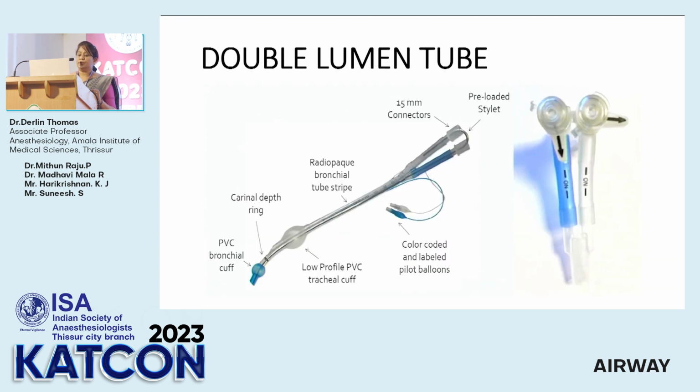So this is a double lumen tube. Here you can see it has got 2 tubes. One is the tracheal tube and the other is the bronchial tube. These tubes are mainly used for lung surgeries where we need one lung ventilation. If we have to ventilate one side of the lung, we mainly use this type of double lumen tube.